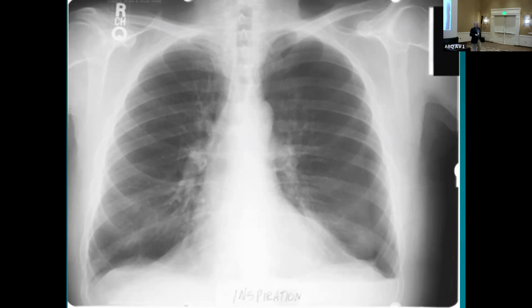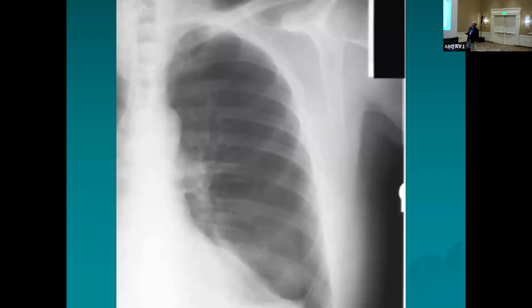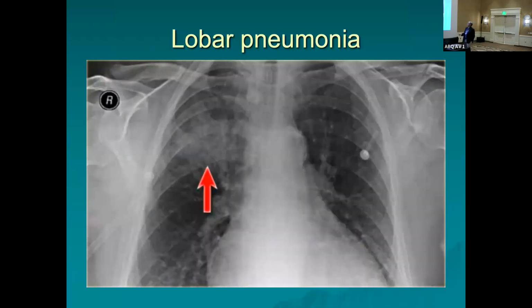That tells me there's air trapped in the lungs. Remember, tissue is going to be a little grayer, salt and pepper. It's going to be a little clearer out through here. You can actually see a difference, how grainy it looks versus how clear that rib looks. And I think I zoomed in a little bit more to let you see it there.